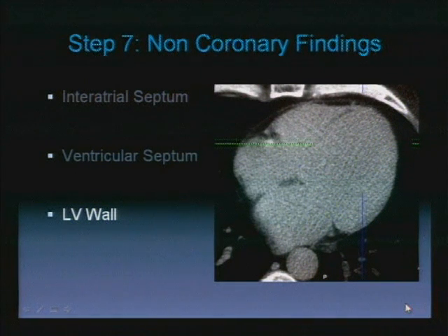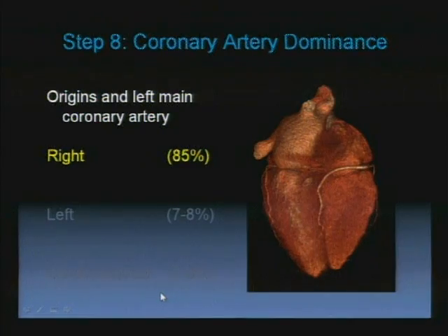But you'll also see other things on the Agatston score, for example, in a patient who's got coronary artery disease or symptoms of coronary artery risk factors, and here's fatty infiltration on a patient who had myocardial infarction. So it's kind of painful, but you have to look at the images you acquire, because otherwise you won't pick these things up, and it does help in your interpretation. And your cardiology colleagues will think we're all very clever, so it's all good stuff.